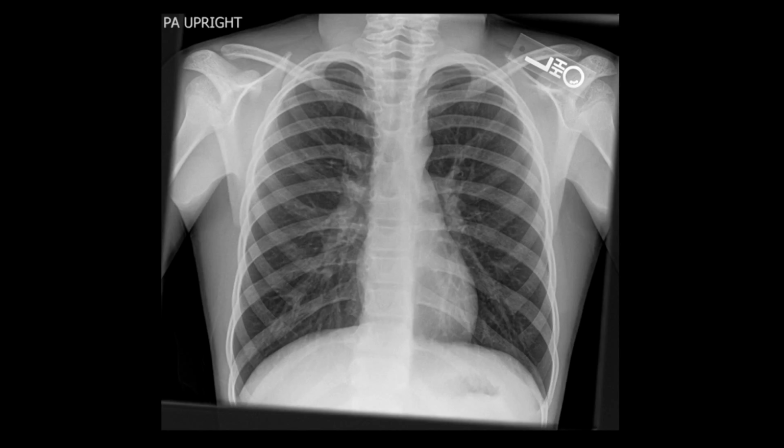So in this patient, when we're looking, you can see that the heart is of a normal size. The lungs are of equal density. And again, you're seeing the nice pleural margins here. So this looks like a normal chest X-ray. Of interest, you can actually see that this is a child's X-ray because they have unfused epiphyses here. But this is a normal cardiomediastinal silhouette, and both lungs are clear in this example. So normal chest X-ray.